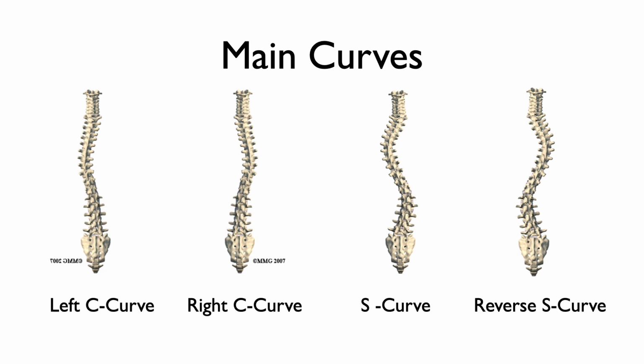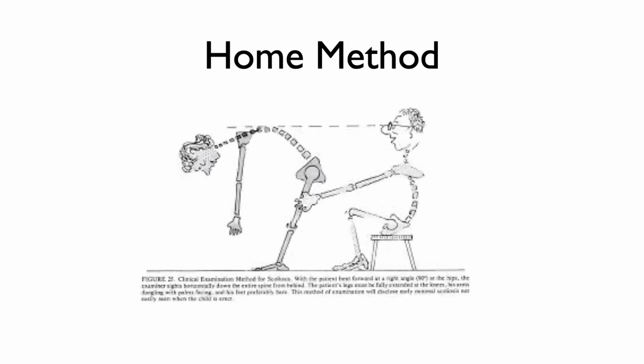This is what people would refer to as an adolescent idiopathic scoliosis. It most commonly occurs in adolescents or teenagers, and so they would have been investigated, but again, there's no known cause. These curves account for 80% of the scoliosis curves out there. I'm also going to show you how to test your curves from home in case you don't have an x-ray, but we'll do that later.